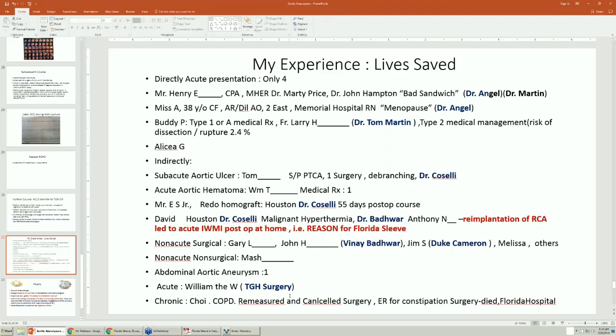And then you saw the patient that we talked about. And here's a lady with abdominal aortic aneurysm with severe COPD. We didn't think that she would be a good surgical candidate because of that. And they said, oh, she's a candidate. They measured the aorta and said she's going to go to surgery. And I went and remeasured. And again, there's problems with measuring it. You've got to get that tangent. You've got to get perpendicular to get the right numbers. We measured, and she wasn't a surgical candidate yet.